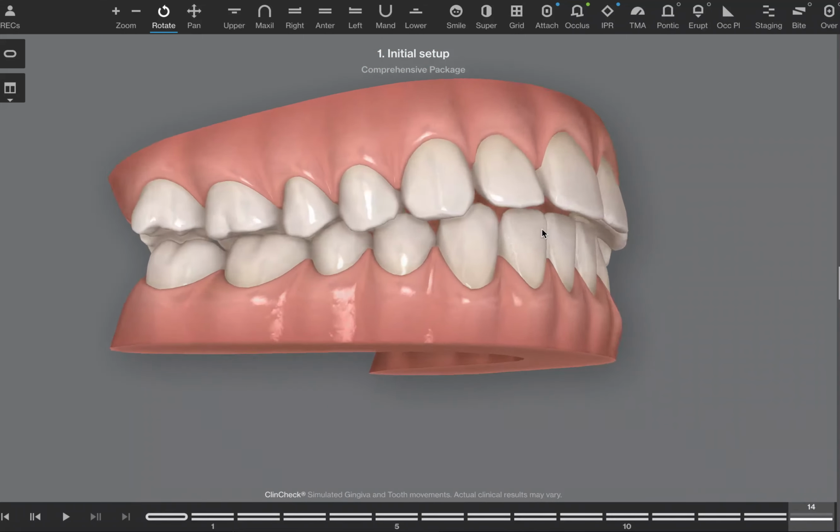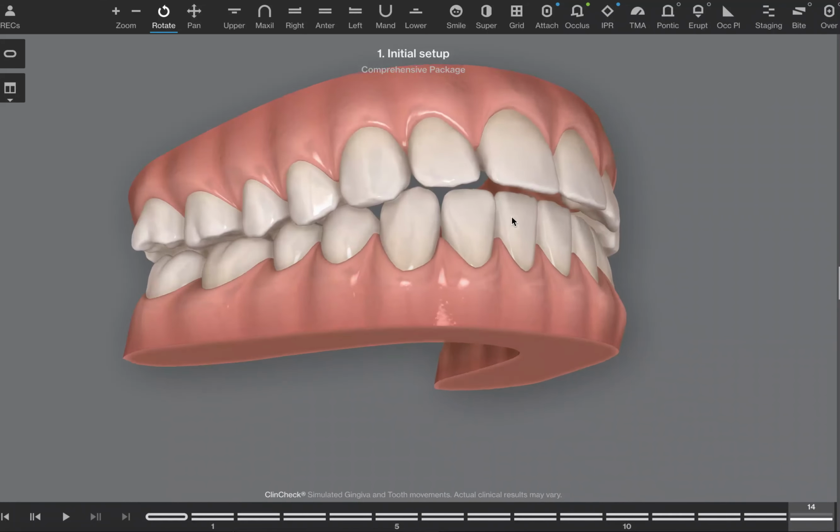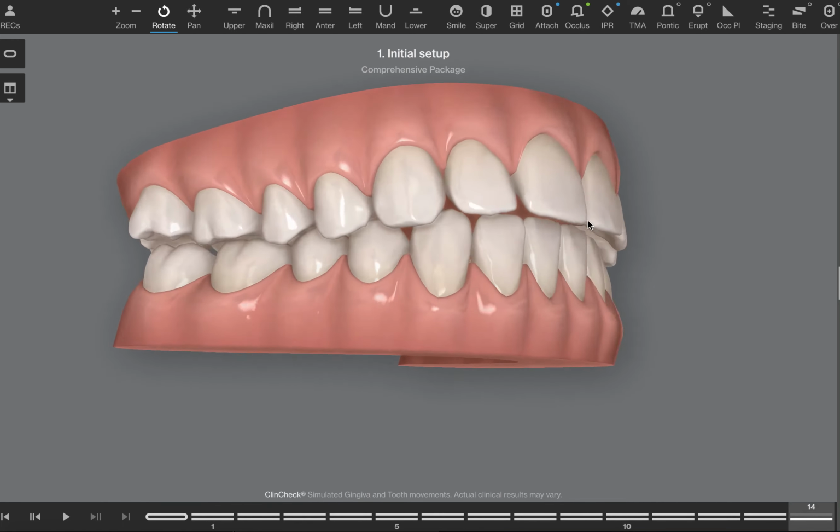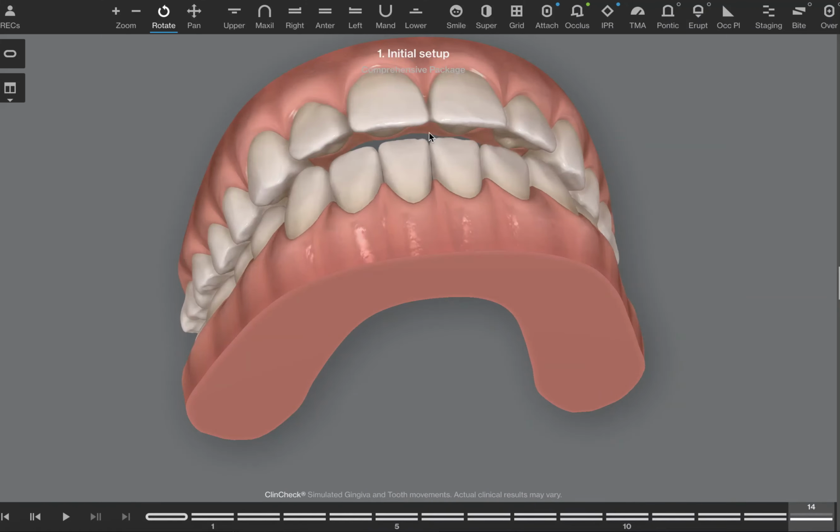If that doesn't happen, or it doesn't happen to 100%, meaning as we straighten the jaws, this whole jaw will actually close this gap. The jaw arcs in a different position, more forward, which is a more airway friendly position. So we often see that happen naturally. My guess is that it'll happen a little bit, but not enough to close this space.